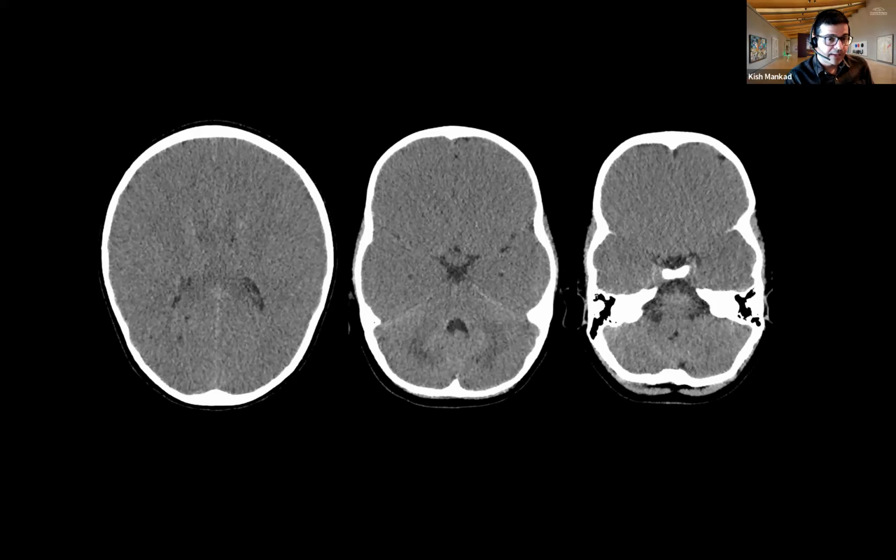This is a child. I can tell you the story again from many years ago. The child's scan was lying on a pile waiting to be reported. They had been referred by another hospital only for developmental delay. So this was not an acute scan. So you can see how much a child can get away with.